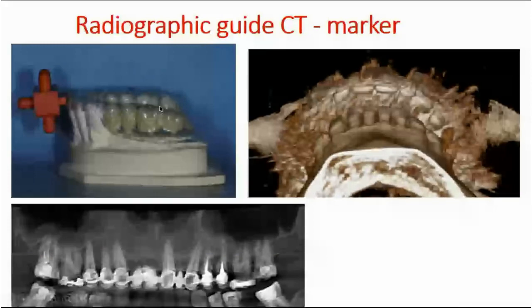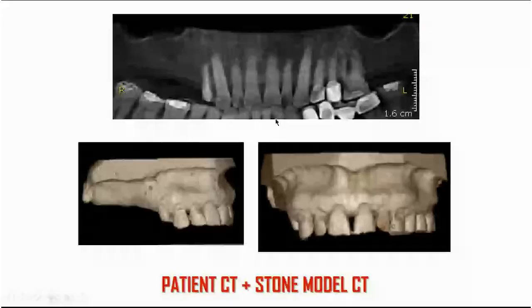And that's why we will need this marker, which will be fitted to a suck down foil, which is made also with radio opaque teeth in the position, and those data will help the computer recognize the position of the prosthetic elements, and the inner surface of this stent, which will be helpful for the recognition and for the production of the guide at the end of our implant planning procedure.